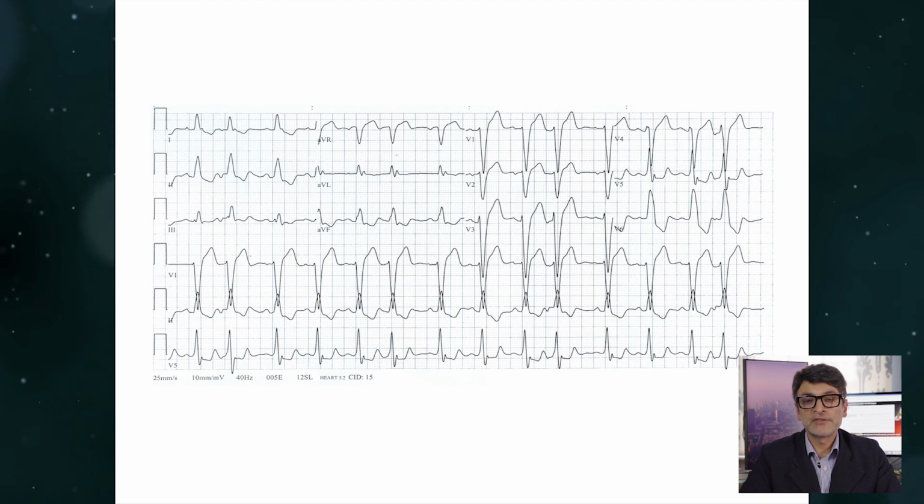So I'm going to now show you some ECGs here. So the question you've got to ask yourself, just think to yourself, and I'll tell you as we go along, is this left bundle or right bundle? And to answer that, you've got to ask yourself, is it thumbs down in V1 or thumbs up in V1? So here we go. First tracing, left or right? Let's give you a bit of time here. So the QRS is clearly pointing down in V1.